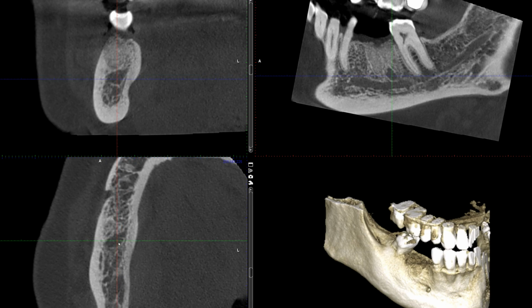There you go. I think it's easy as a dental student, or someone who is still learning to interpret CBCT, that this could come across as a very worrisome feature. And I've seen my own students considering a wide range of benign lesions for something that would appear as this one.